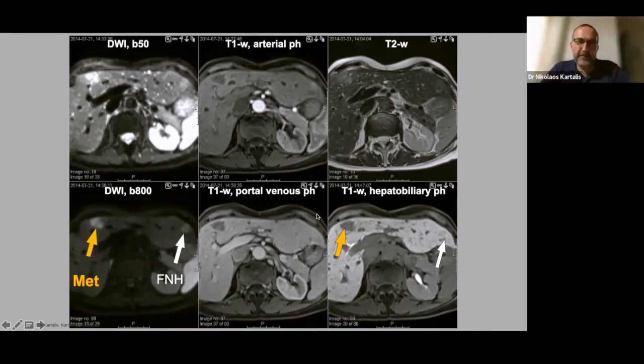So liver steatosis is a problem when we evaluate the MR images, but we still have the in-phase and opposed-phase images, so we can at least see that there is something wrong in the liver, but still the ADC is reliable, at least when the liver is not completely fat replaced. Yes, I have the same impression, yes.